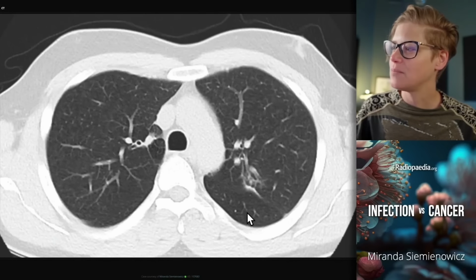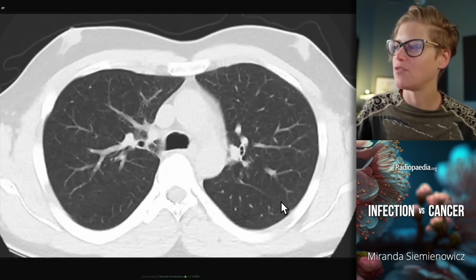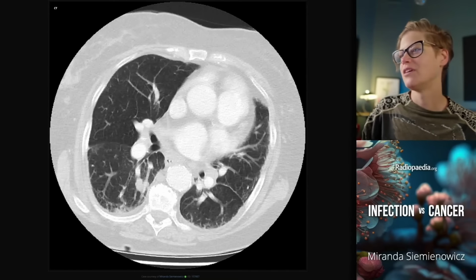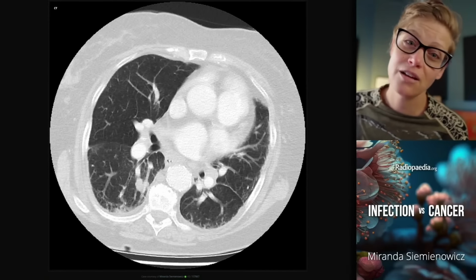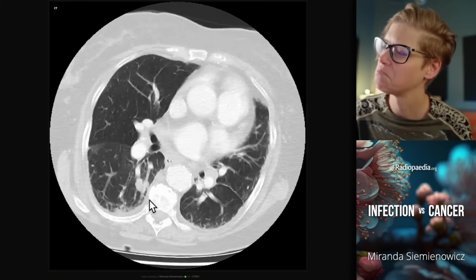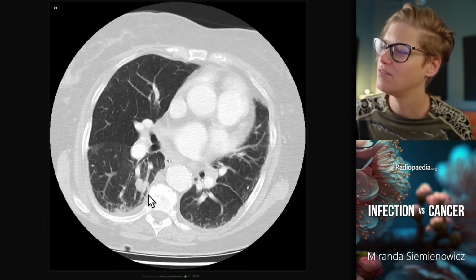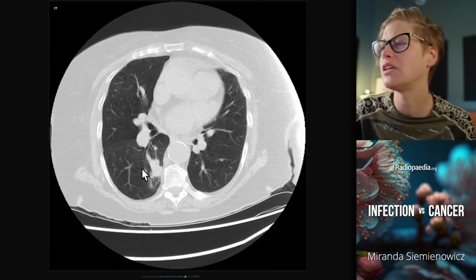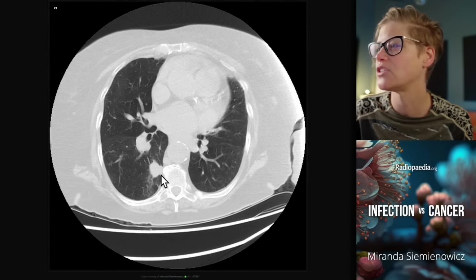When we follow this up, empirical treatment with antibiotics, and we've got near complete resolution after a few weeks. Companion case, a lobulated lesion in the right lower lobe. We've got these large lobulations. Okay, what are we dealing with here? Flagged as cancer, repeat CT in 6 weeks, and it's significantly increased in size. Again, everybody's worried. So what are we actually looking at?